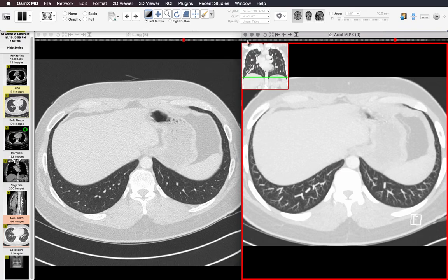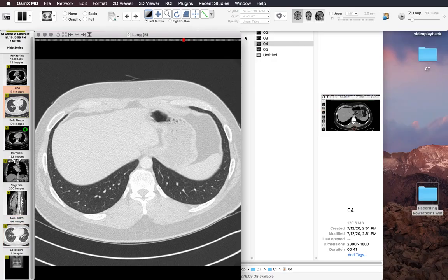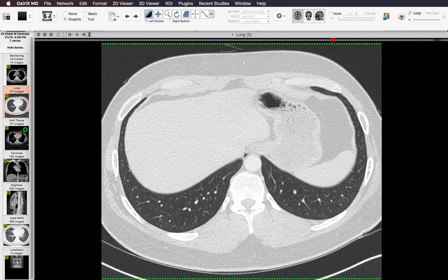All right, after looking for nodules, then my job is done. During this whole process, I've been dictating the abnormalities that I see, and it would be at this time that I read my findings and summarize them in my impression.